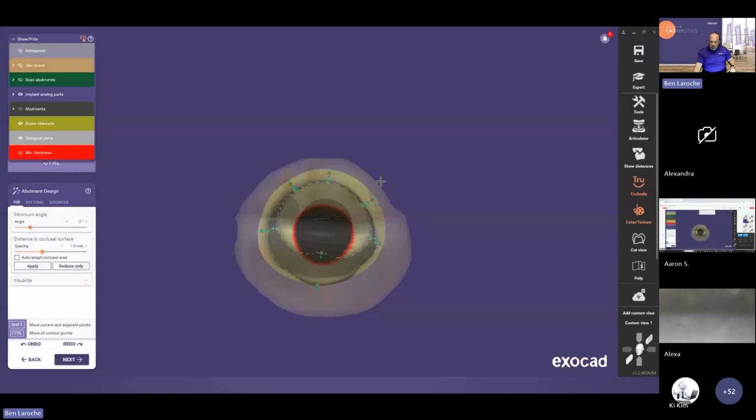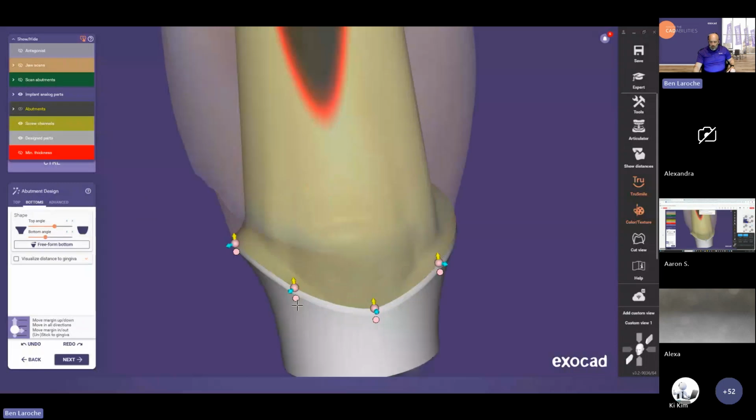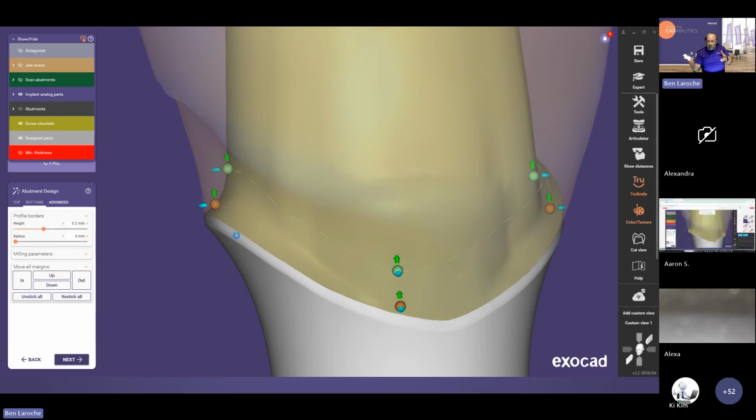And then I can jump back to my abutment bottom. Now, for those of you that are concerned about this little lip, it is based on materials. And if you remember, in the very beginning we said we were doing zirconia here. So what we need here is the equivalent of margin reinforcement or horizontal reinforcement on a crown. This is for manufacturing. If I'm doing a pre-mill or something in a metallic material, so cobalt chrome, titanium, anything like that, I can go into a sharp edge.